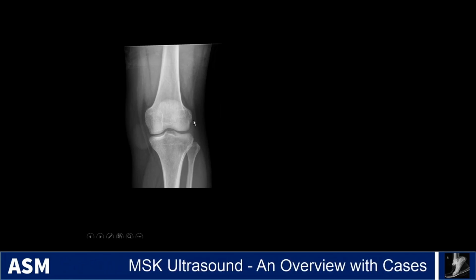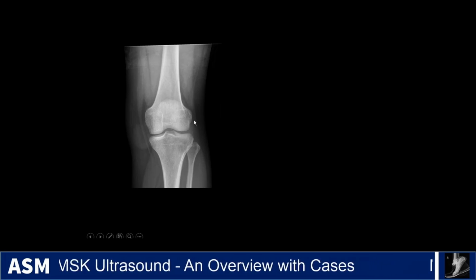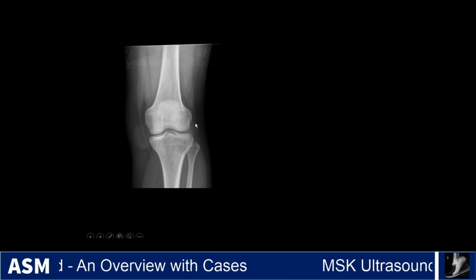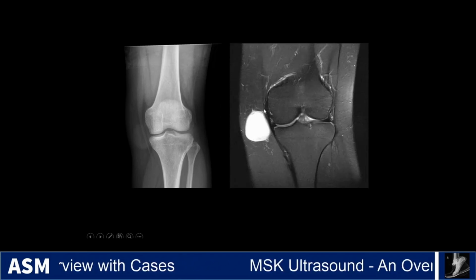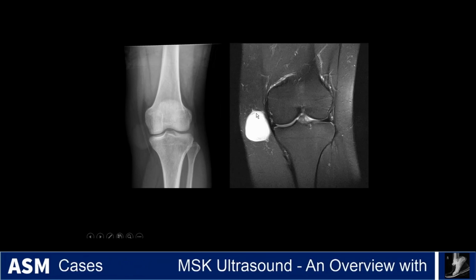Over here we have an x-ray showing a mass on the medial side of the knee. The pes tendon's coming down this way. I'm going to try to avoid showing masses. I'm just going to show a couple just as an example, only because I have a series of ultrasound masses on the channel, a bunch of videos showing different cases. So if you're interested in seeing more on ultrasound appearances of masses, take a look at some of those videos on the channel. This one, a cystic looking structure, and I showed this just because this is a comparison to that parameniscal cyst we saw.